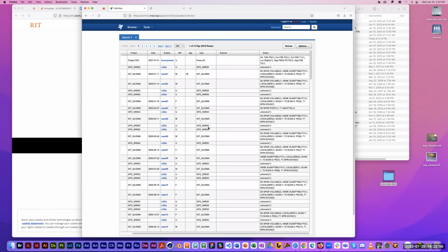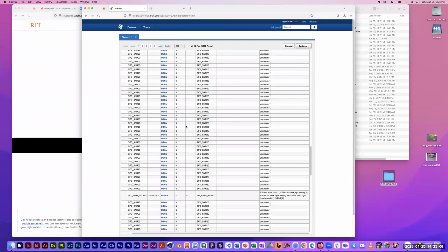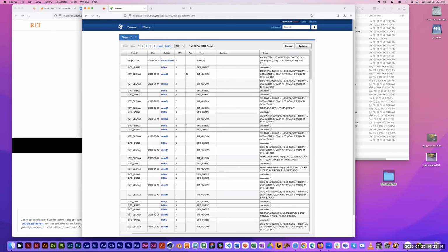So I'm not going to bother downloading one of these, but you know, you could always spend some time exploring these. But at least, you know, you have access to a lot of MRI data here if you really wanted to retrieve some and explore it. All right, so that XNAT, that's one source for data sets that are relatively easy to download.